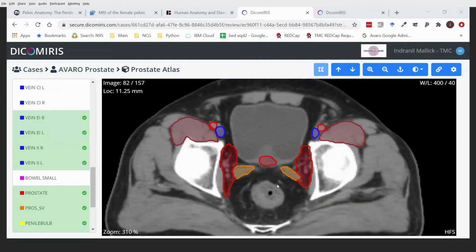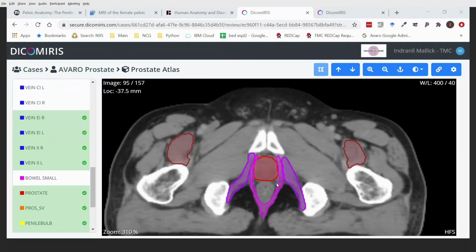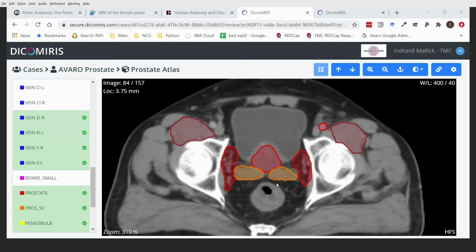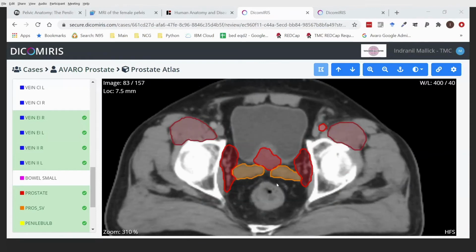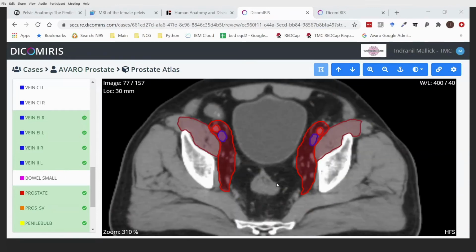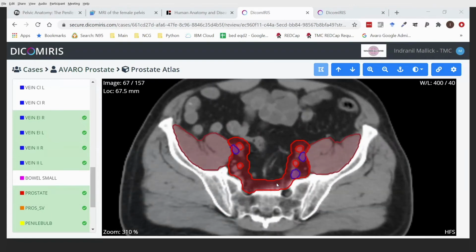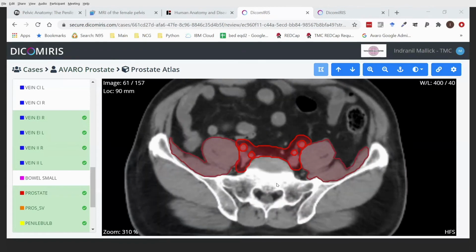Okay, so I'm going to stop sharing this screen and quickly go over to the second part, which is the post-prostatectomy contour. Now, before we go there, of course, it's a question of image guidance and PTV margins.